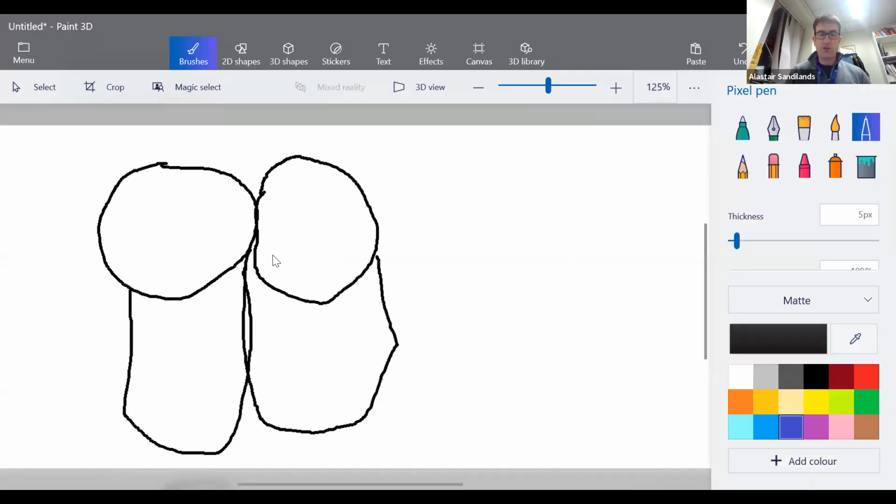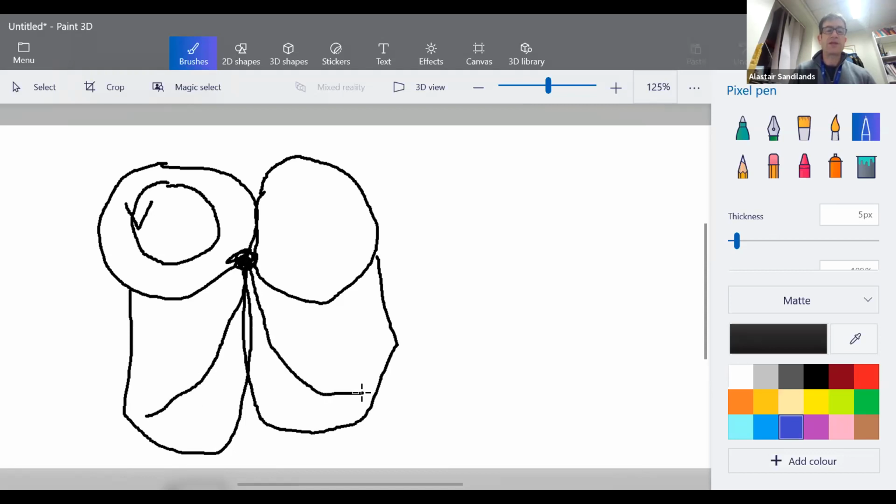Okay, so hopefully you can see all this now. What are the rhythms that we can see? So atrial flutter travels around the right atrium in a counterclockwise fashion. Here's the AV node here. There's the right bundle that goes down here, left bundle that goes down here. So as I showed you, if you look at this macro reentrant flutter traveling around, if we just looked at the flutter alone, we just see a continuous flutter wave. That's just on its own.